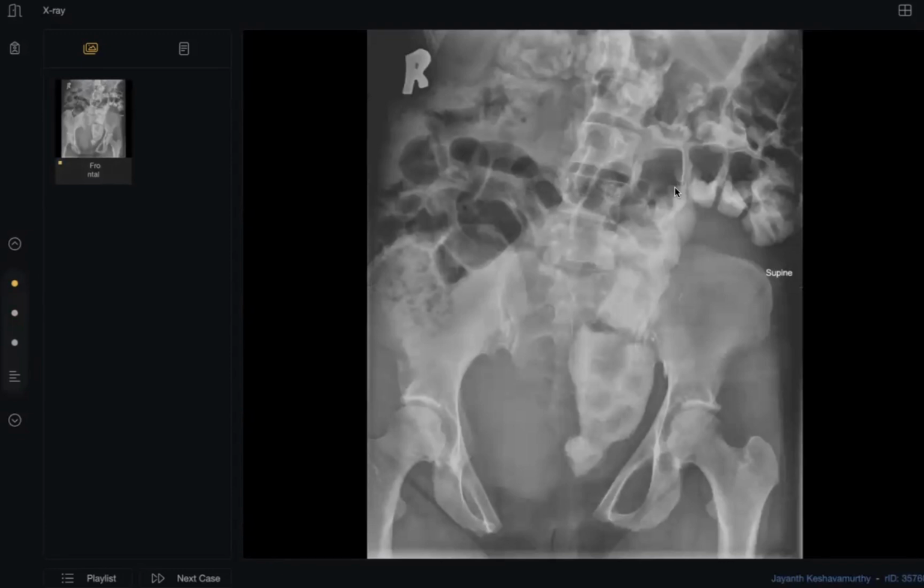What is this? There is widening of the pubic symphysis. The rest of the bones are grossly unremarkable. I think the urinary bladder is going to be in an ectopic position, located superiorly. So this is called... I couldn't remember the name actually. No problem.